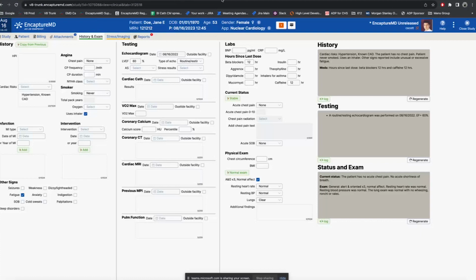When I read, I don't want to read in isolation. I want to be able to read with additional information. Not everybody does that, but that's my thing. So I want as much as possible to know these things ahead of time. And so if my staff gather that up, this is a place for them to put it so that when I get to this point, I can see it all.